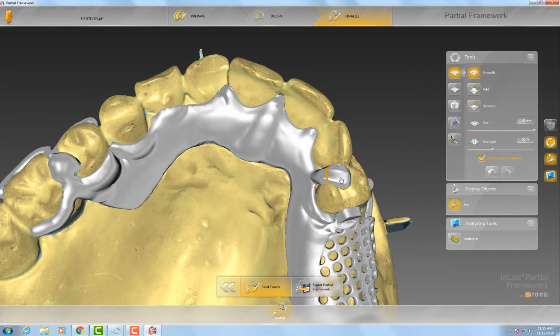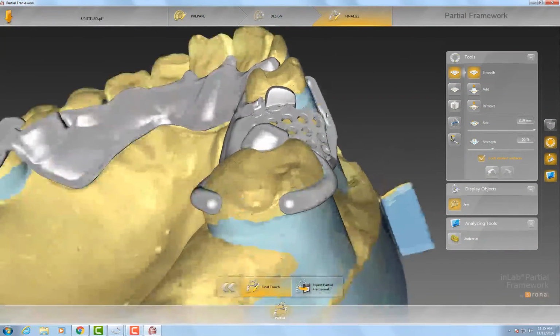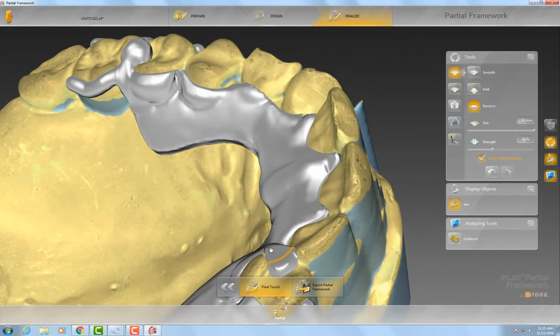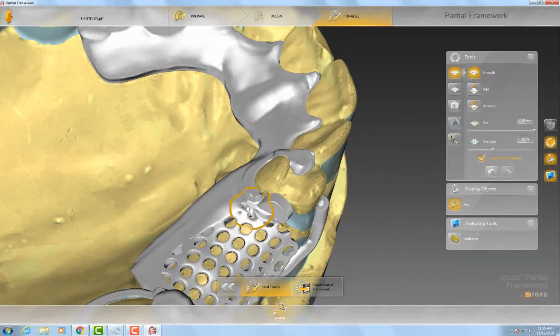The more you do and the more you take care of your design, the less post-processing you have to do, which is also a really good thing, and other people will really love you for it, especially those people who are strictly CAD techs and not actual RPD people or anything along those lines. It will take care of it all for you.